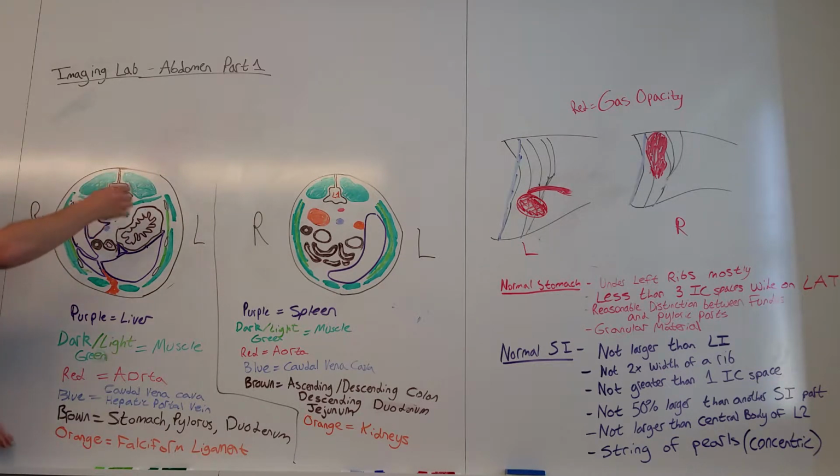Now, I've drawn in some muscles. Let's talk about those next. So, as usual, our muscles that are lateral and dorsal to our vertebrae are going to be our axial muscles. And then ventral to the vertebrae, at this level, we can still see some of the musculature of the diaphragm, the left and right crura. The right crus extends a little bit more ventrally than the left crus.